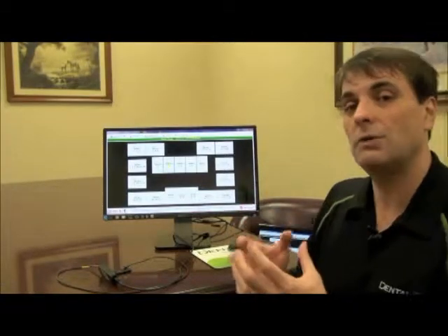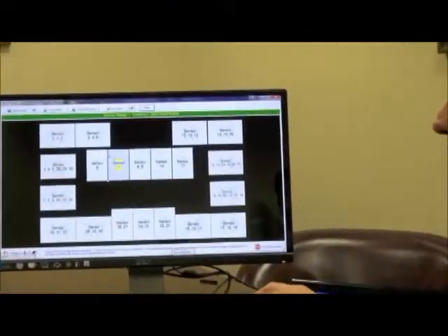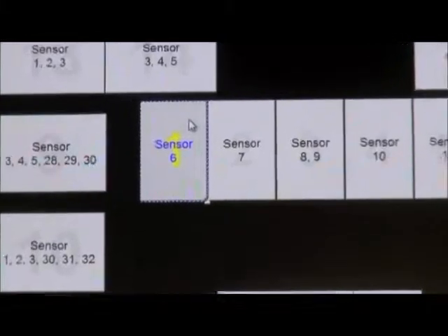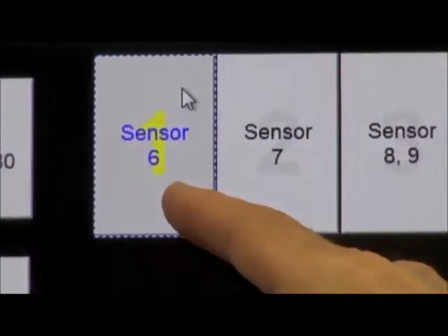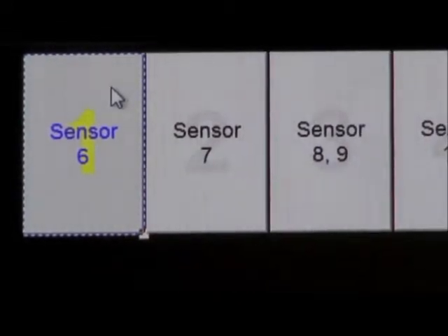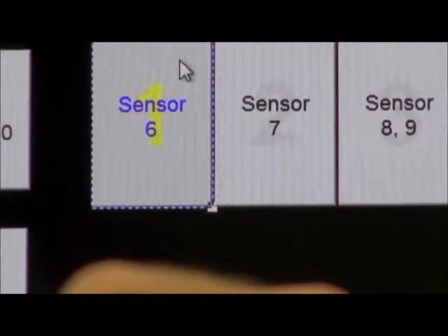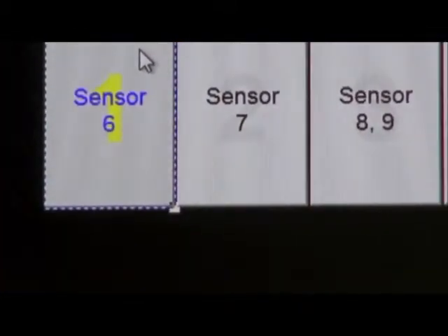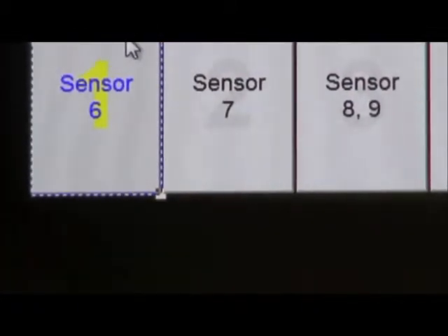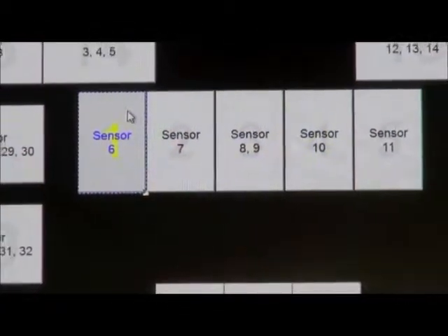Now, if the x-ray in number 1 needs to be retaken, we simply take the arrow and highlight number 1, and it will take the next x-ray and place it in this box and then advance to number 2. Down in the lower right corner you'll see what looks like a little pad of paper indicating that you have more than one x-ray in that tile, and you can actually choose what x-ray you want to represent that tile.